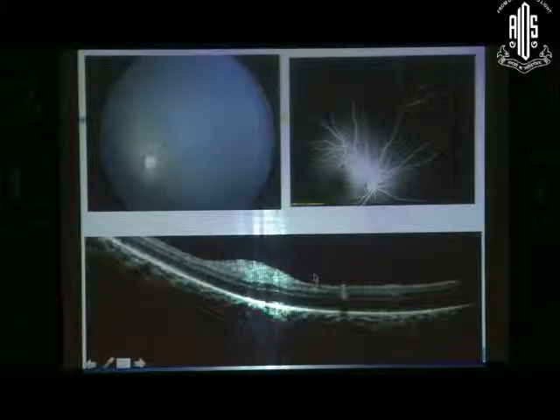So what's curious here is the way the OCT and the angio have a play between each other. So the OCT in the right, very obvious lesion, is showing some undulations of the inner retina with a possible vitreomacular-like traction. So it's obviously the hyaloid getting lifted off there, and there's some changes happening here. The other lesions are much smoother, and there is no vitreoretinal interface interaction.